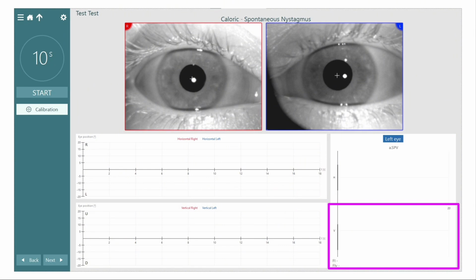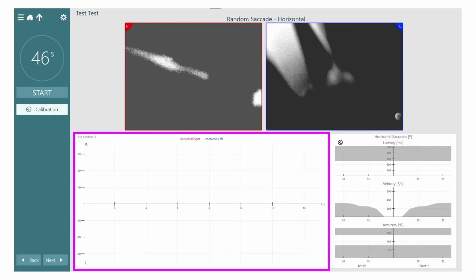Now, the other thing to see here on this top section where it says left eye, it's just measuring left eye recordings, but the eyes should move conjugately, which means they should move the same. So if it's a left beating or a right beating, in theory, if it's a peripheral issue or no issue at all, then they're going to move the same direction for the most part. So it doesn't really matter. We just typically pick one eye for that. And that's the default.